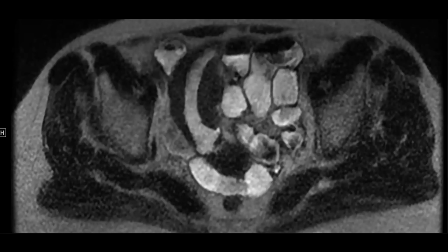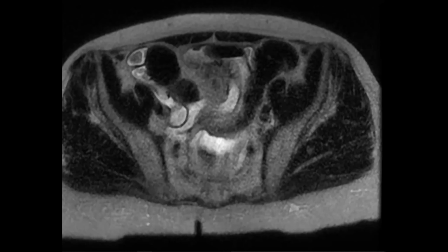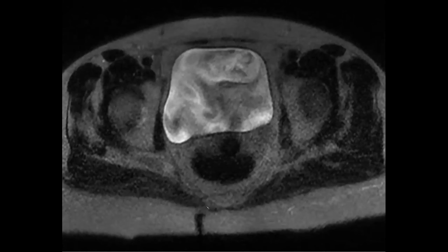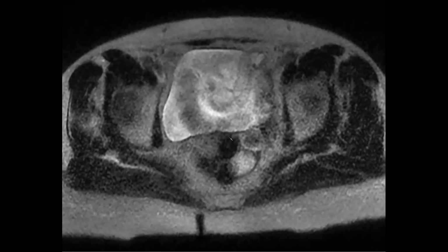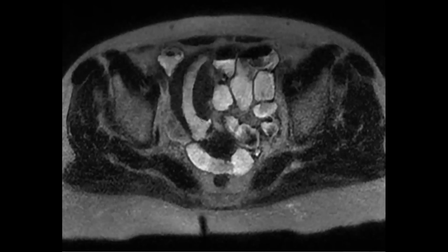Okay, this is my next case. This was an MRI for a patient with abdominal pain. Someone in my group shared this at our conference. So if you look in the pelvis, there's this interesting thing here. This is a female, and we don't see a uterus. Initially you could think this could be the uterus, but they'd had a hysterectomy. So what do you guys think about this?